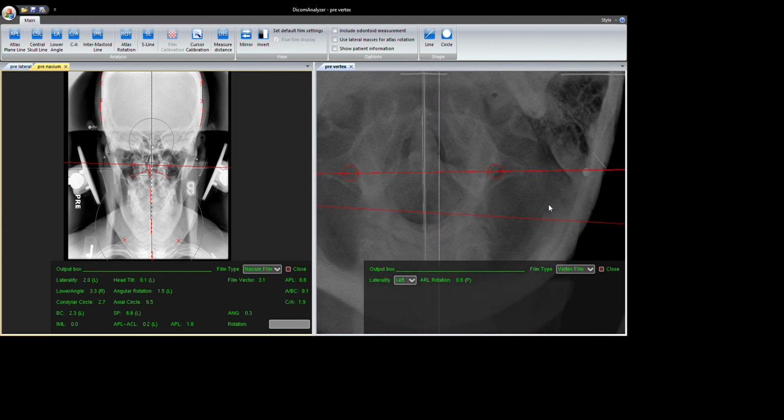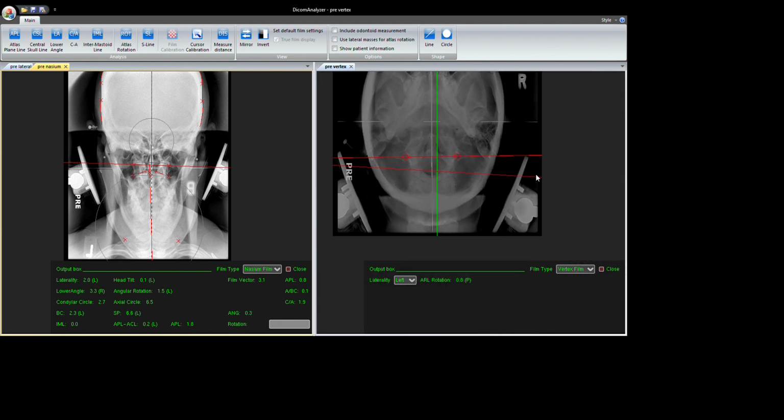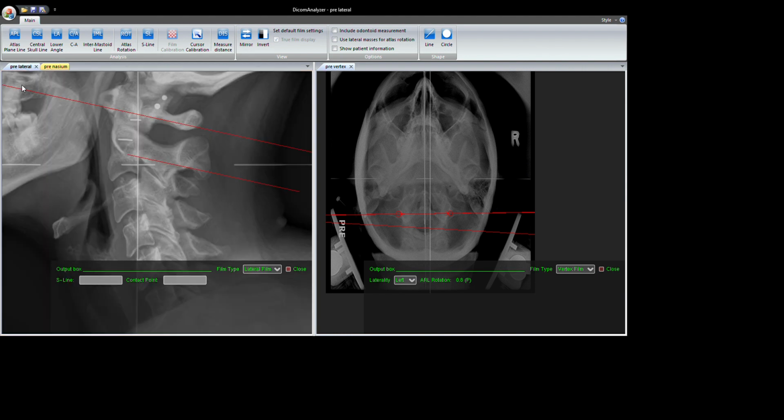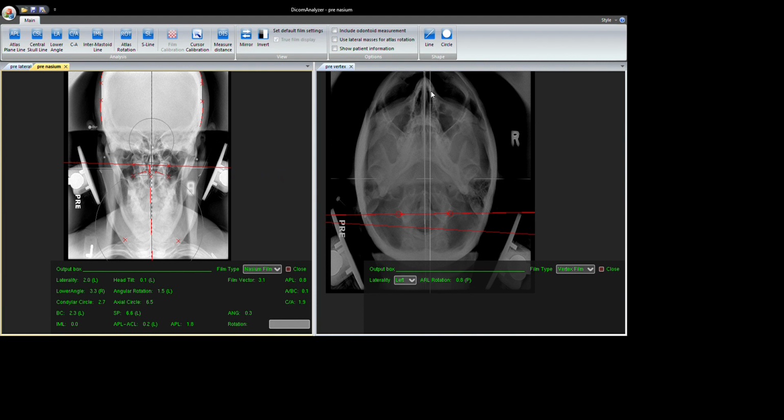So this is an excellently taken film. It's definitely within a quarter degree, possibly better, but that is a way to accommodate and figure out, okay, how close am I? Is this usable? Is it not? And be able to do the measurements in the original way that it was taught and in the book. I think that covers pretty much everything. There are some outside cases of ways to do things, but this gets you the intro and where to start. Hopefully you find that useful.